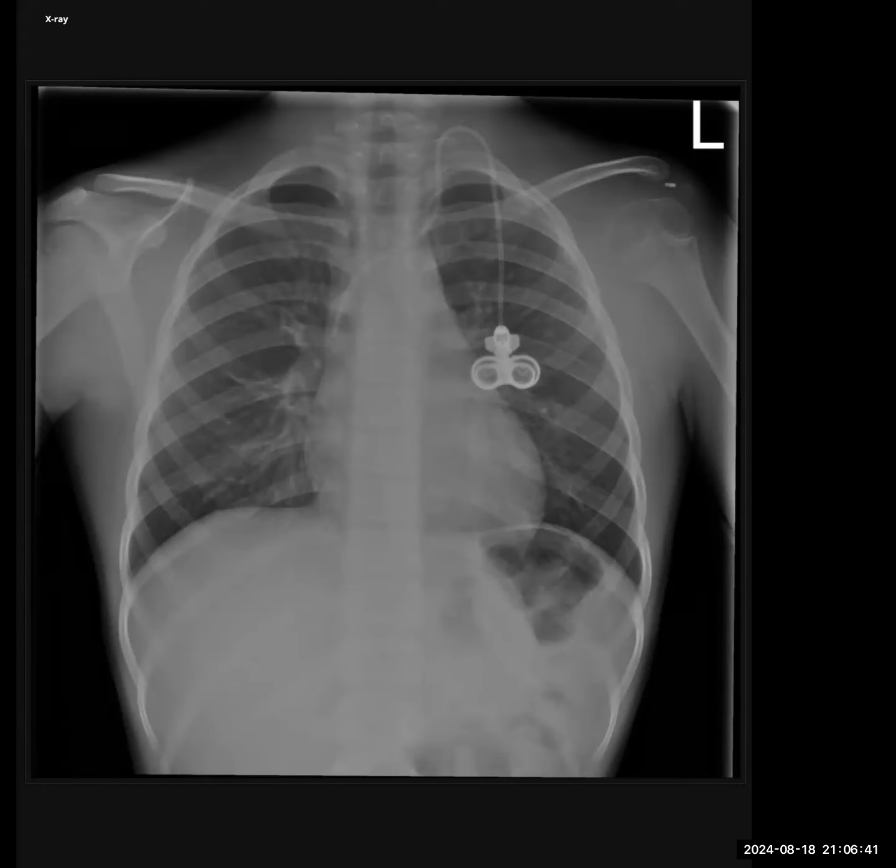I'm provided with the frontal chest radiograph of a skeletally mature patient. On the first glance, the bilateral lung volumes are maintained. There is a line in situ. I think this is a central line, which is placed appropriately in position at the cavoatrial junction. I'm going through my checklist. I'm looking at the lung bases. They appear normal. I don't see any obvious pneumomediastinum.